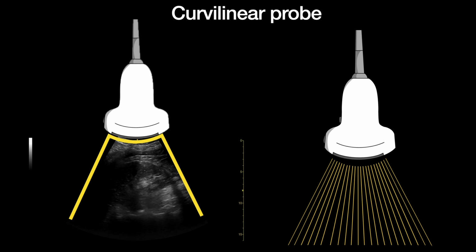Of course, there are other probes, such as intracavitary probes, probes that we use in esophageal echocardiograms, even probes that are used intraarterially. Those probes have a different array of the sound waves, and the image that you are going to see is a little bit different. However, we do not use these commonly in the clinic, so we are not going to talk about them.